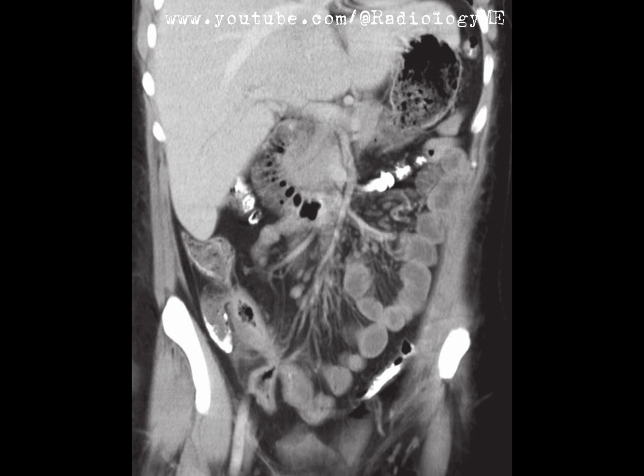One striking feature is the convergence of the distal ileal loops, forming what we call a cloverleaf appearance in the right pelvis. This is classic for a cicatrizing process. Basically, bowel loops becoming adherent due to inflammation over time, leading to adhesions. This appearance, alongside the changes in the terminal ileum, strongly suggests Crohn's disease with complications like an enteroenteric fistula.